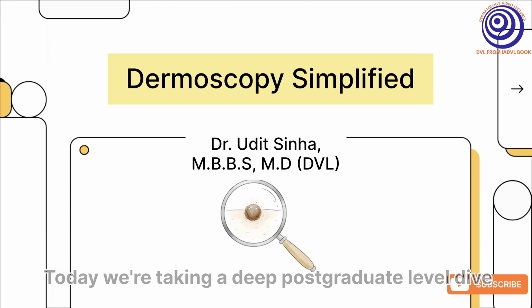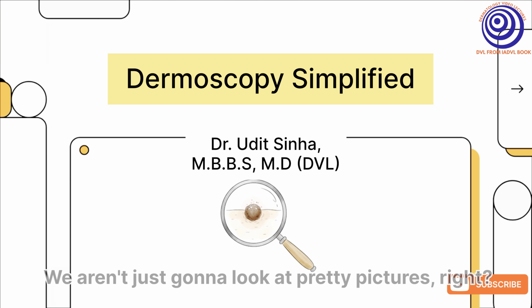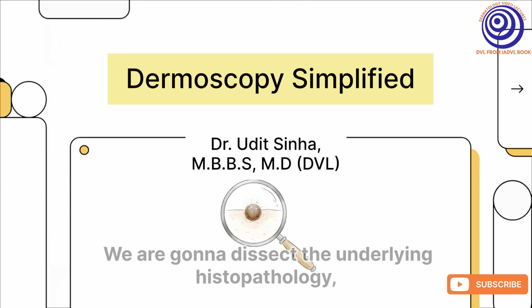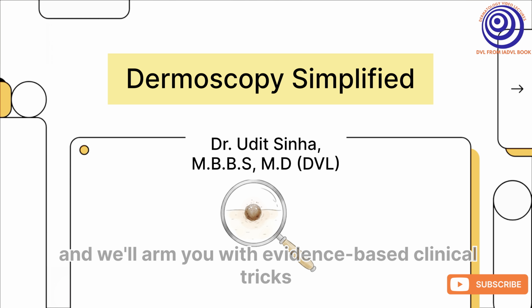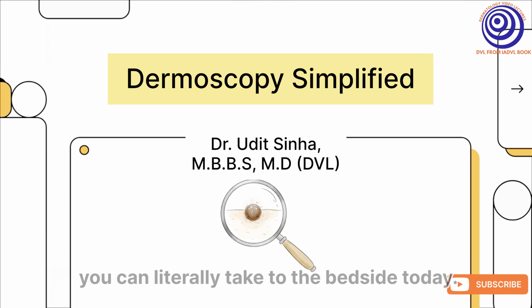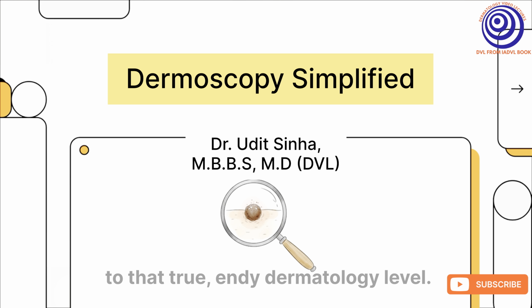Today, we're taking a deep postgraduate level dive into the advanced dermoscopy of pigmented lesions. We aren't just going to look at pretty pictures, right? We are going to dissect the underlying histopathology, we'll decode the established algorithms, and we'll arm you with evidence-based clinical tricks you can literally take to the bedside today. So get ready to elevate your pattern recognition to that true MD dermatology level.